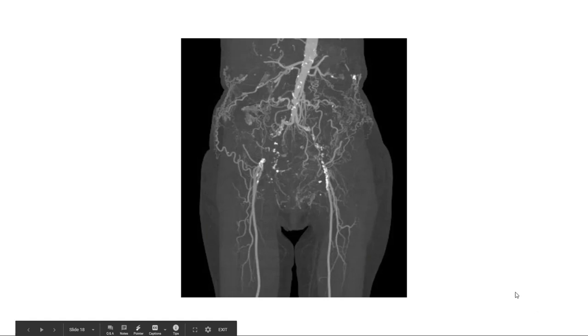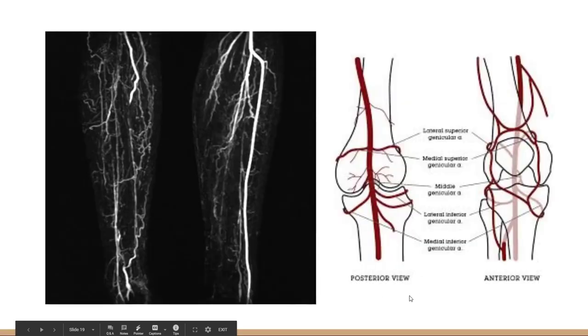So this is actually a nice example of how 3D reformat, or in this case it's a 2D reformat, but I'm sure it is a 3D volume rendering reformat, aids in the actual diagnosis and visualization of collateralization. These are very nice to show patients the extent of their disease, and it's great when the technologists or whomever can work the software to create them. Lastly, we're seeing here some tibial collaterals, which can arise from geniculates, or can arise from the tibials themselves, either the artery affected or other neighboring ipsilateral arteries. Also important to mention.